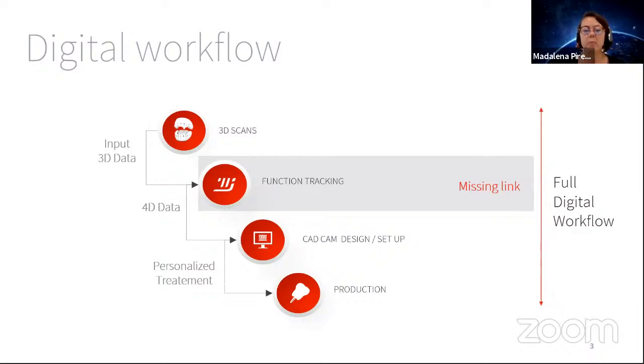And with this, we're going to be able to do a personalized treatment through the CAD/CAM design. So, like I said, we are fully integrated with Exocad. Exocad can read all of our data, but also we have a lot of customers working with Dental Wings and 3Shape. And I will explain then in the process how we can use our data in those softwares.